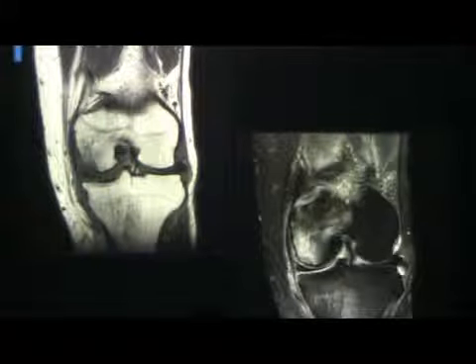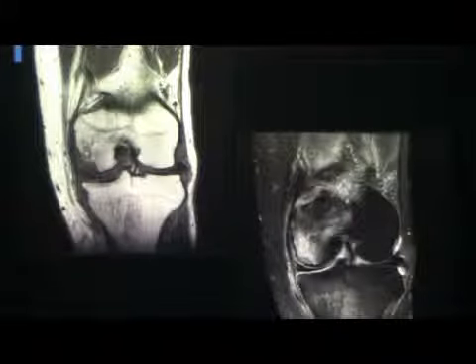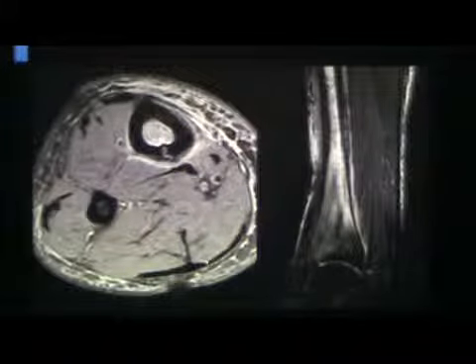Another case, a lot of edema, a lot of fascial edema with that. So something is happening there. Look at T1 weighted images. There is this concentric line, so that's a fracture there. There is a little fracture there, very little signal on T1. So that's basically a reactive edema, more on T2 or fat saturated versus non-fat saturated. The more you have a process in the marrow, the more edema you'll have. The more you have a process in the cortex or the periosteum, there will be less edema.